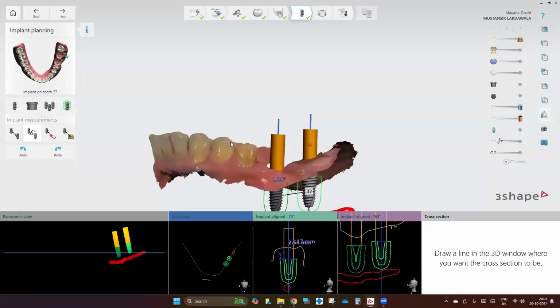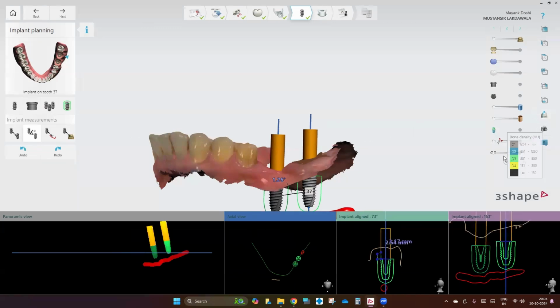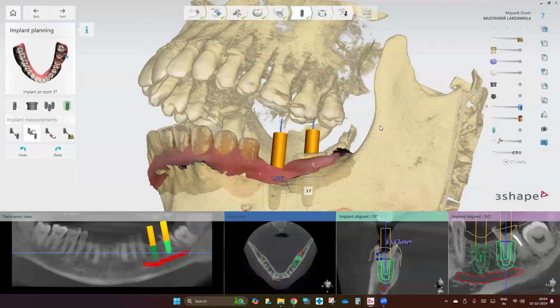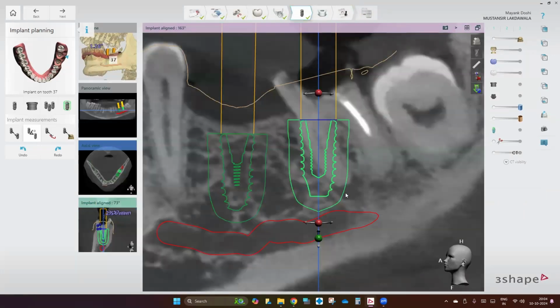If कभी जरूरत पड़ी दिखाने की तो आप यहाँ पे ये टूल यूज करके you can actually draw a virtual plane also. कोई फ्यूचर के केसेस में I will show you the application of this in more detail. इसमें जरूरत नहीं है इसलिए मैंने सिखाया नहीं है. ठीक है? So if you noticed, ये चीज मैंने कभी देखी भी नहीं थी, ये अपने आप हो गई, like this being away from the infection happened automatically.